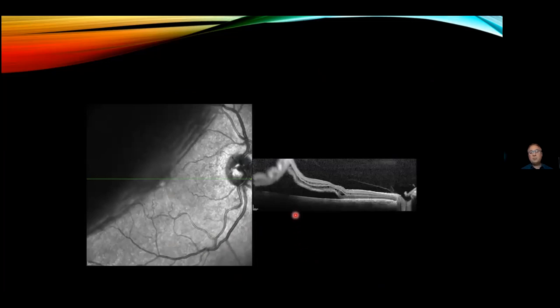So if we look at the previous thing that we had, we might say, okay, but that's neuroretinitis. But have a look at the slide. So there is the optic nerve. There it is. There's no swelling of the optic nerve, and there's definitely no connection between the nerve and the retina. This is something sitting on the patient's temporal and superior part.